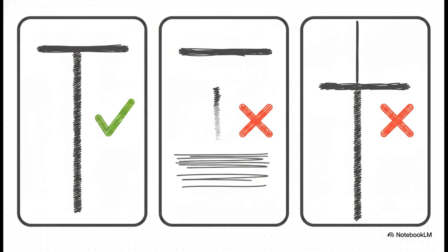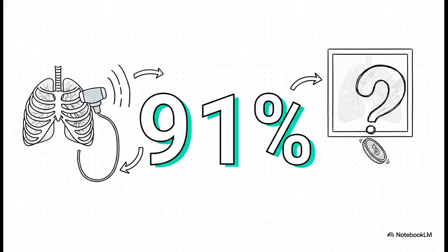Not every vertical line is a real B-line. A true B-line moves with respiration and wipes out your A-lines. But you might bump into Z-lines. These are just short vertical static lines that sort of fade out down the screen, and they leave the A-lines totally intact. Seeing a Z-line actually implies there is no pneumothorax. You also want to watch out for E-lines. These start way up at the skin or the subcutaneous tissue, not down at the pleural line. E-lines indicate subcutaneous emphysema, which means there's an air leak outside the lung itself.